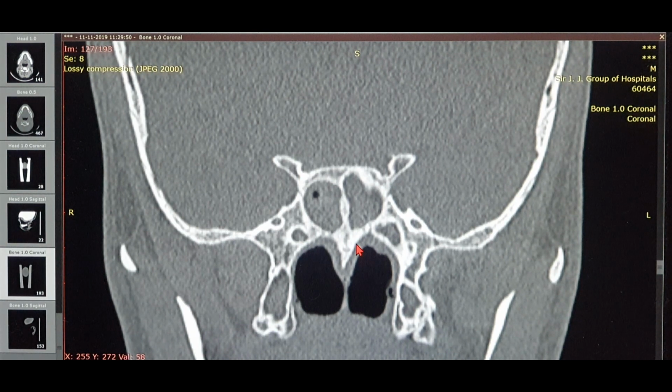Vidian is median. It's very easy to remember. I'll repeat again, always remember the rule: Vidian is median. That rhymes a lot, right? Whatever is medial is Vidian, and whatever is lateral and superior is always V2, which is the foramen rotundum. And what is V2? It's the maxillary nerve. So this is the foramen rotundum and it contains the maxillary nerve.